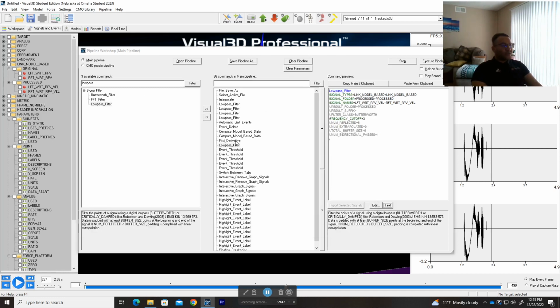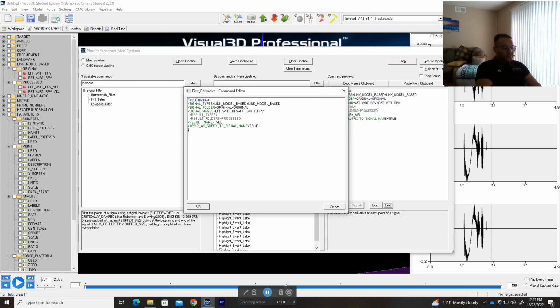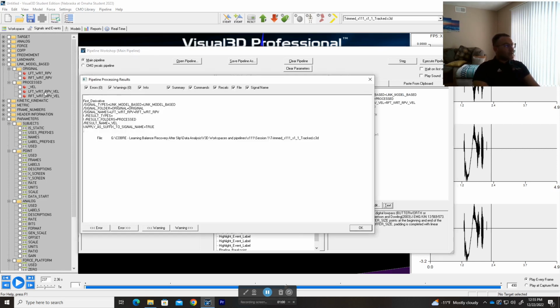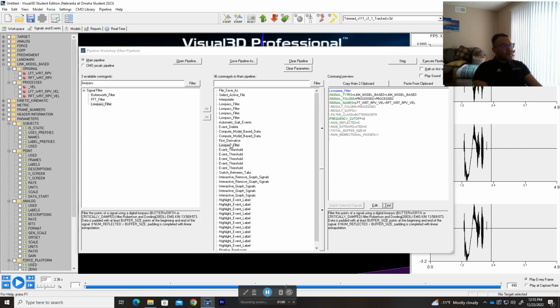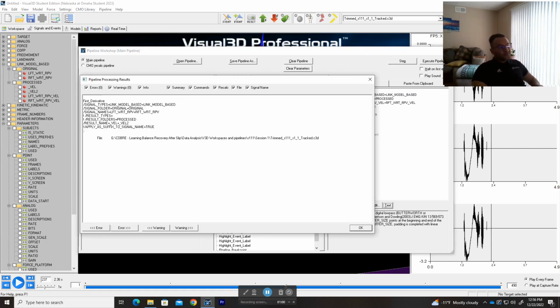But if, for example, I go here, and again, if you want like a more user friendly, you can just keep it like this, and then unclick here. Or if you want to go to the text, if I concatenate this and I click OK and run it again, it will give me like a velocity, you see. But it only gave me one because I did not add a plus sign. So if you want to give another one, let's say velocity 2, and now I should create both of those. See, like velocity and velocity 2.